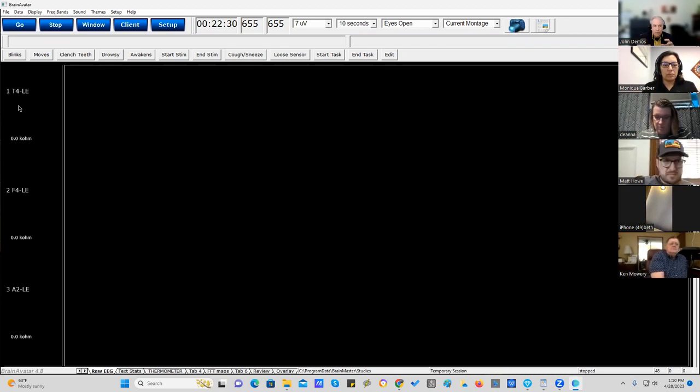And now we're connecting the amygdala, T4, with F4, which is the anterior location of the insula. And the insula is very much involved with anxiety. And so Jules chose these sites based on the data. So if we started with QEEG Pro Z-scores, which is a fine thing to do, and the client's not progressing, we could move right to this protocol right here.